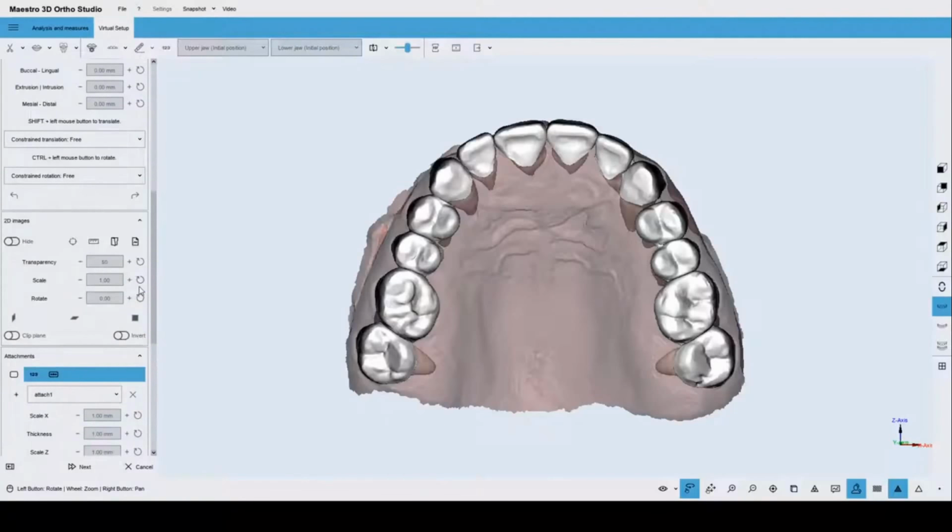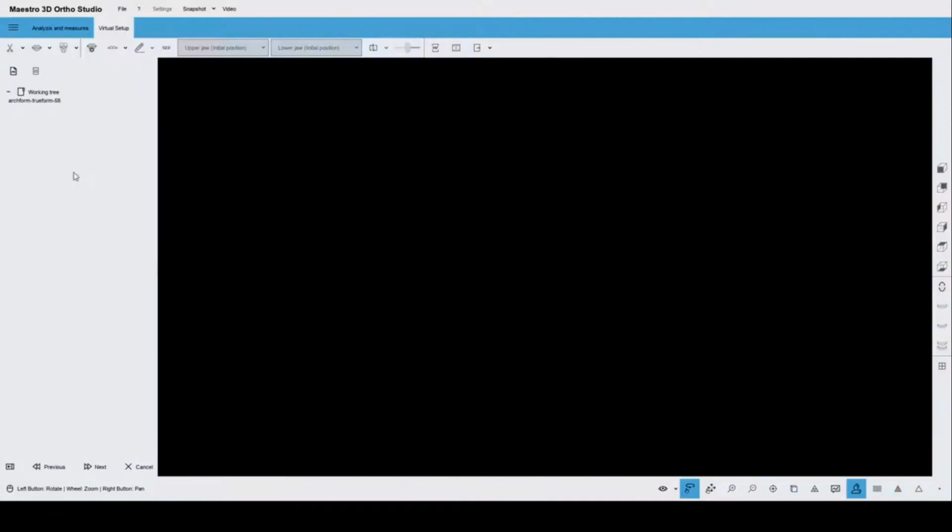is the option to upload some pictures from the disk or from a library of previously imported pictures.